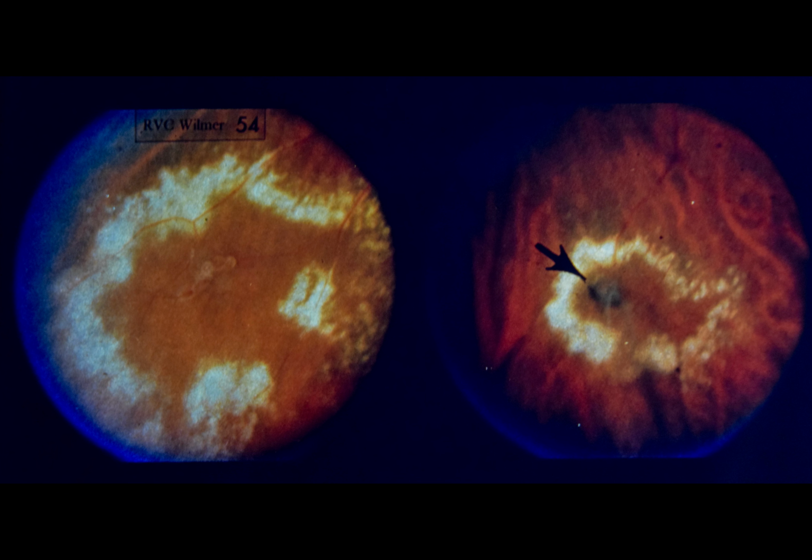Note absence of vessels peripheral to inferior edge of lipid. Arrow points to green area in center of lipid ring. This probably represents subretinal lipid with secondary migration of pigment from RPE. Comment: because this patient was asymptomatic and because there was no macular involvement, no treatment was recommended. He has been followed 1 year without change in vision or fundus appearance.